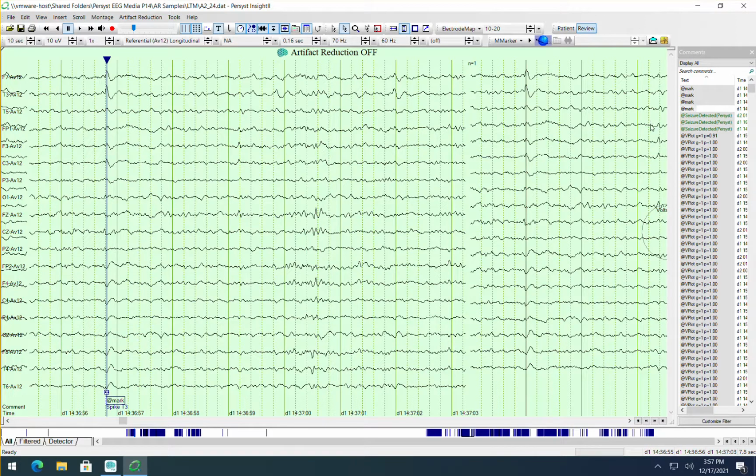And it's a little bit off the page here. And so you'll notice there's a blank spot. There's a blank stripe going down the left side of this, and that's the border between these two. And when I put the mouse cursor above that, it turns into a 2-headed arrow. So that's going to be important, because when I click, then the border appears, and I drag this to the left.